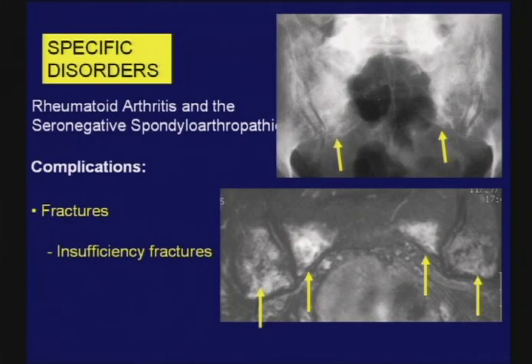There are other areas, as Dr. Vizar noted, about the pelvis that are classic sites of insufficiency fractures, including the parasymphyseal bone, where they can look like chondrosarcomas. Also the pubic rami, the iliac crest, certainly the femoral necks, even the femoral heads in a subchondral location.